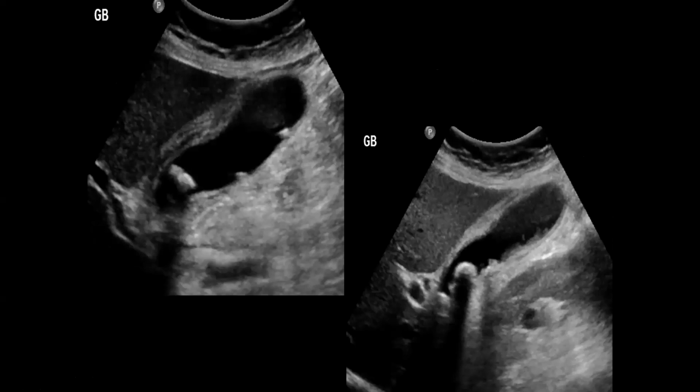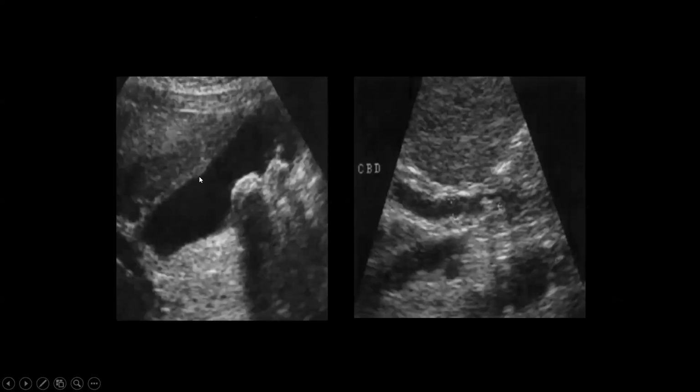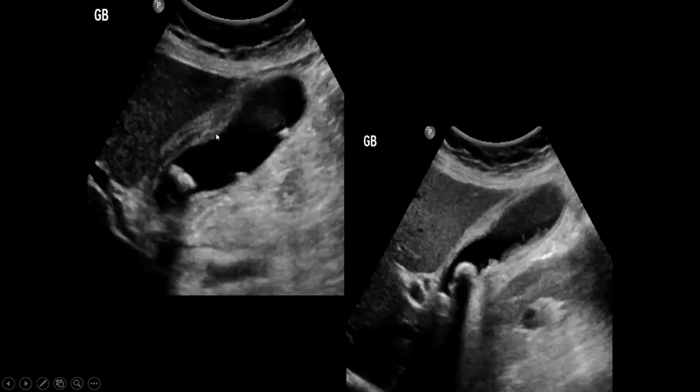So what do we see in acute cholecystitis? There are some imaging features you can see on the images and some you cannot see on the images. For example, the imaging features that you find in the images is the stone, which is usually impacted in the neck of the gallbladder. You can see an echogenic structure with shadowing. You can see the thickening in the gallbladder wall. The thickness of the gallbladder wall should not exceed 3 millimeters. You can see clearly the thickness here. If you compare it to the previous image, you can see very nicely there's no thickening of the gallbladder. Well, in this case, there's very clear thickening of the gallbladder wall.